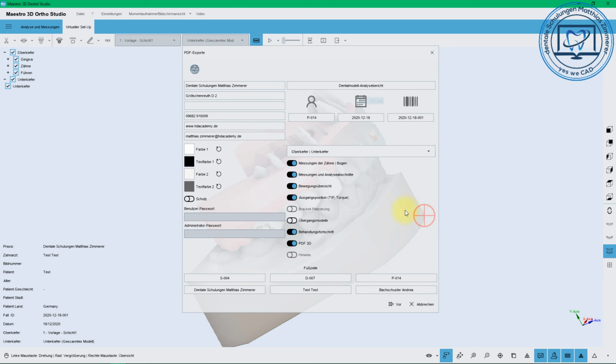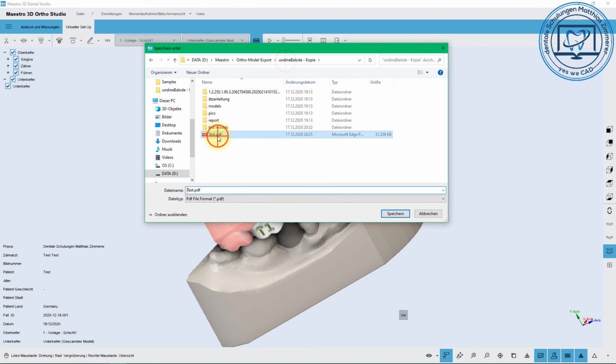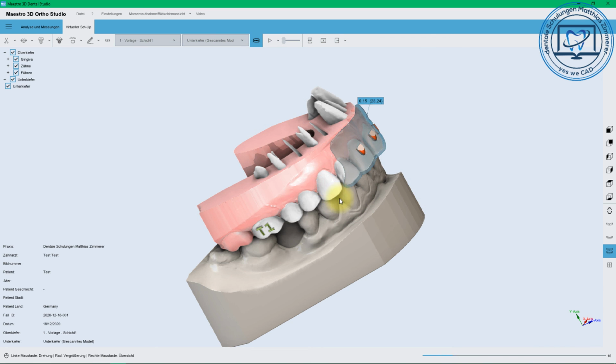You can adjust the report like you want. You can put in what you want. You can choose the colors of it. You can have your logo on it. You can name it like you want. You can zip it. You can close it with a password. Just set up your export, and the software will tell you it's exported.